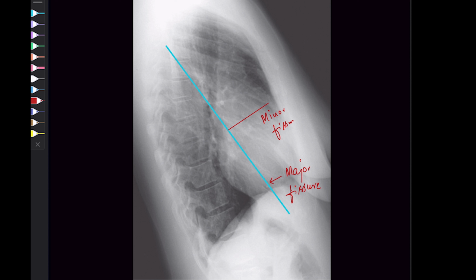Now, vice versa, if the X-ray appears over-penetrated, we may mistakenly think of something else. The lung is appearing dark. So now we can mix it up with emphysema or pneumothorax and we cannot pick them. So that is really important if we are handling a person who has emphysema or pneumothorax. And if the image is overexposed, like if it's over penetrated, then we might miss these diagnoses.